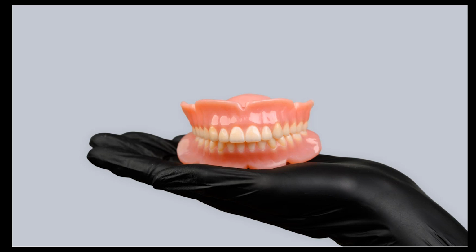Now, when you want to start playing around with the different True Voxel features, you can use the rectangle select here and select all the teeth in the same arch and apply the cervical staining to them, or remove it, or change the shades. And now, if you want to apply the internal structures to the denture or remove them, the default setting is cervical staining turned off and the internal structures turned on.